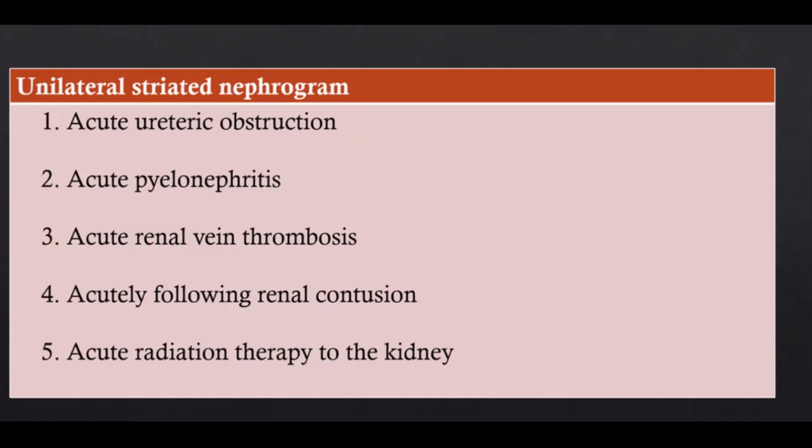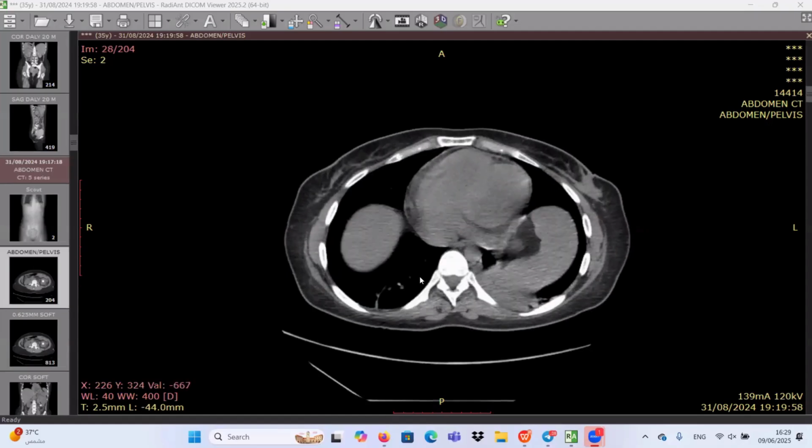You should correlate this with inflammatory markers and the clinical findings. This case had elevated inflammatory markers and was proved to be acute pyelonephritis. We should also do urine analysis and urine culture for the case to check this.